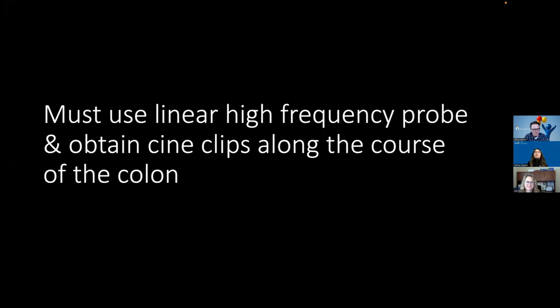My main message for this hour, regardless of everything that I say or show, is always going to be: if you want to perform bowel imaging, in this case looking for appendicitis or intussusception, you must use a linear high frequency probe. Obviously, not all probes are created equal, but optimize it to whatever setting is most optimal, and also obtain cine clips along the course of the colon. Those are the two musts in order to be successful with evaluating for appendicitis or intussusception.